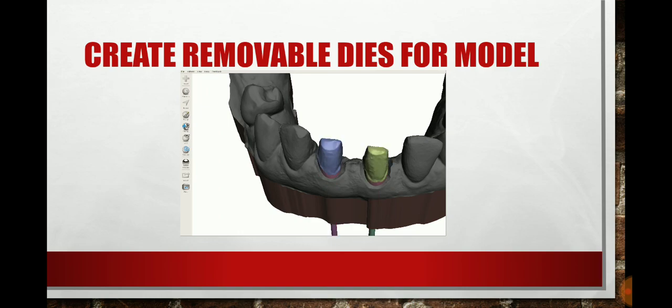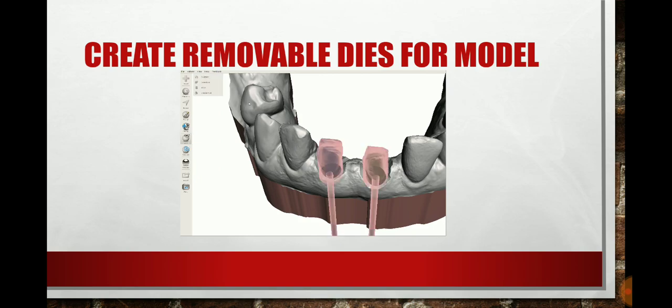There's nothing else that you can't do in Meshmixer for the most part, as long as you're willing to sit there and at least try it and see how it is. It's a very invaluable tool, and I hope you guys are learning a lot from it.